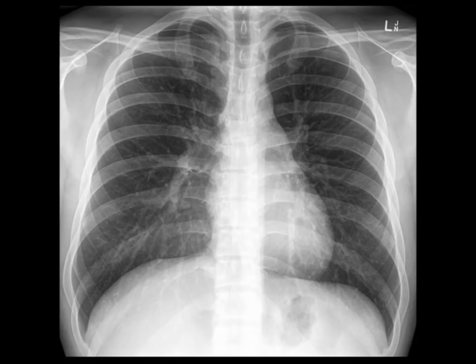There are no fractures, lesions or defects visible in the bones. Cardiac silhouette is not enlarged. Both hemidiaphragms appear normal and with no blunting of the costophrenic angles. The edges of the heart and major vessels are clearly visible. Left and right lung fields are clear throughout. A gastric bubble is visible and there is normal hilar shadowing. In summary, this is a normal upright PA chest film.